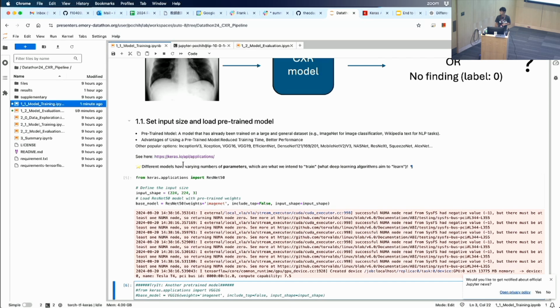And then most of the images are loaded as 224. So all the work we did yesterday for pre-processing should be preparing you for this. And then your base model, you're going to use pre-training. You're not going to train from scratch because you don't have all the images that are required. And we feel like the lower layers that are needed are sufficiently learned from cats and dogs.